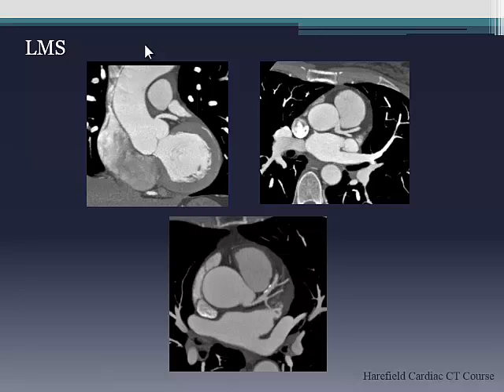It's really important that you develop a system, especially when you're first starting cardiac CT, because it can be quite overwhelming. Those of you from a radiology background know about this concept of satisfaction of search. You'll see a stenosis, you'll feel really proud of yourself because you've seen a stenosis, and then you'll miss all the other problems in the heart. And that's the quickest way to destroy your service, okay?